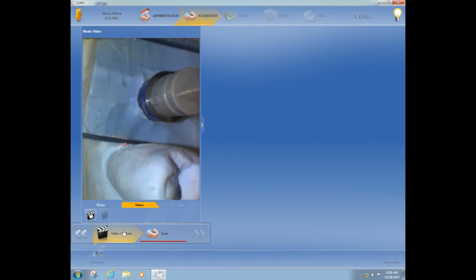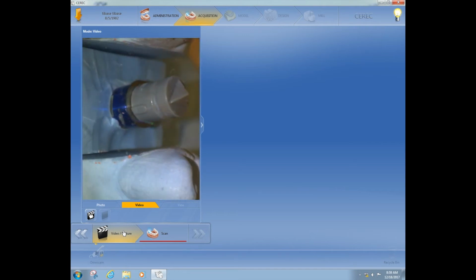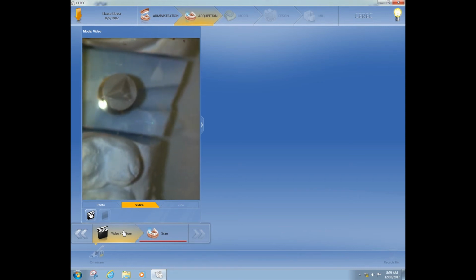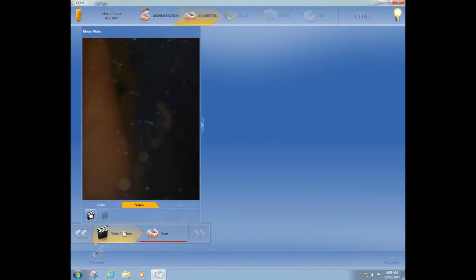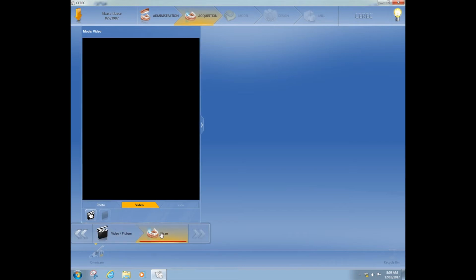You can kind of see now that little bleb or push out is where that has married up with the TiBase, and it's fully seated. You just push down with your finger and make sure it's seated. In the mouth, you may have to use a hemostat to make sure it's fully seated. Suggestion: you can also mark that little outcropping with a marker, like a Sharpie. But once that's on, you can go ahead and scan it.